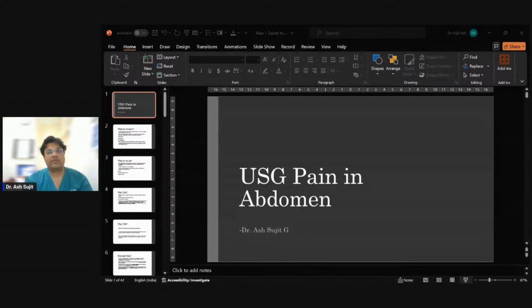Fluid levels and peripheral nodules result from clot retraction, which can also be seen. This we have discussed in hemorrhagic cysts. Multiple small echogenic foci within the wall of the homogeneous cyst are also quite typical. Doppler analysis is not very useful in endometrioma because there's not much internal vascularity, as we see in the corpus luteal cyst.